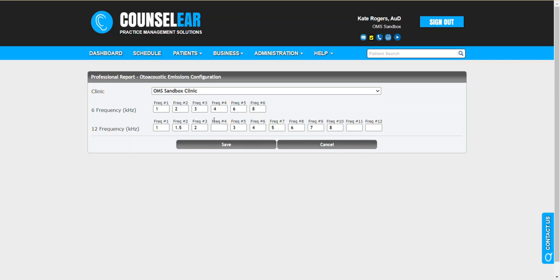You can see here, for example, they skipped number 4, so we likely would correct that. This is someone who is just testing something out, and probably later on would say, I should correct this and get these in order. But the point is you can situate these however you like. You can do decimals if you like, so that this reflects the specific frequencies that you need. And typically, you're going to look at your test equipment as a reference point there. So let's just say I'm going to leave it at that point, or you could make that more fine-tuned from there.